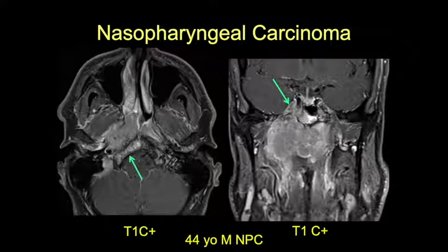This shows classic imaging of a nasopharyngeal carcinoma. We have this large enhancing mass in the fossa of Rosenmuller and nasopharynx extending anteriorly to the nasal cavity, laterally into the parapharyngeal space fat, and posteriorly into the prevertebral musculature, and partially encircling this horizontal internal carotid canal. We also see that there's bony invasion of the clivus with enhancement in the entire right clivus on this image.